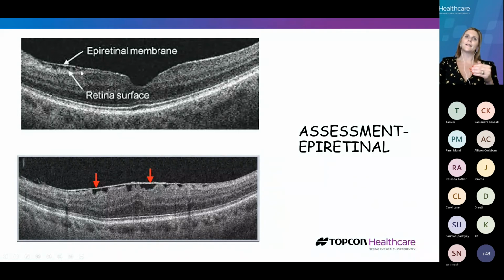When we're looking at it, sometimes you'll just see a little sparkle like this. Other times you'll see it holding on at the inner retinal focal points. I like to think of these little teeth that it's holding on to. And here we can see that we haven't really got much change to our retinal profile, a little bit thicker, but again, still just about got our normal foveal depression. No changes really in the intraretinal section, no sign of any subretinal fluid or anything changing in the subretina. And our photoreceptors, our ELM and our RPE are all still intact.